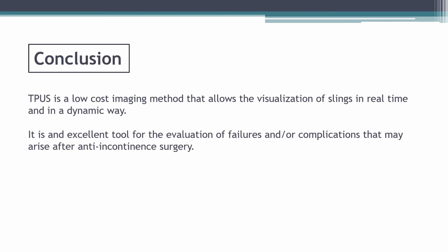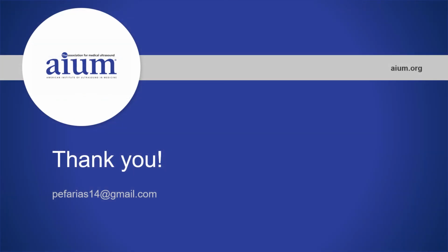In conclusion, transperineal ultrasound is a low-cost imaging method that allows the visualization of slings in real time and in a dynamic way. It is an excellent tool for the evaluation of failures and/or complications that may arise after anti-incontinence surgery. Thank you very much.